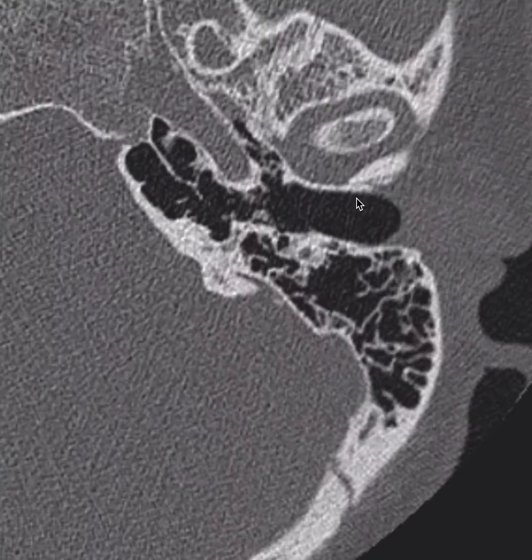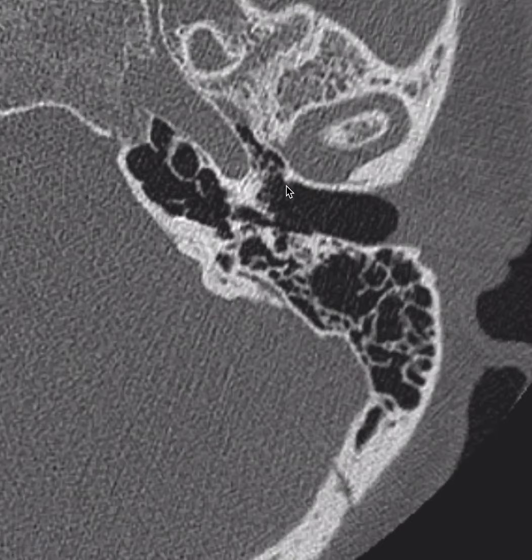Scrolling superiorly now, the tympanic membrane is right here, forming the medial wall of our external auditory canal. This here is a tympanic portion of the temporal bone, with the medial portion here completely intact. I mention this because sometimes there can be a defect here with protrusion of contents from the glenoid fossa backwards. This is called a foramen of Huschke, and is pathologic if it is present beyond the age of 5.